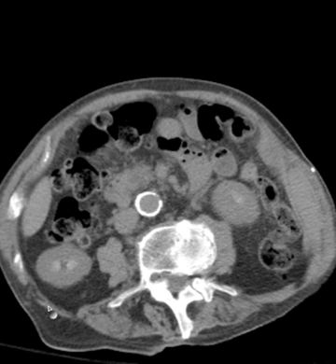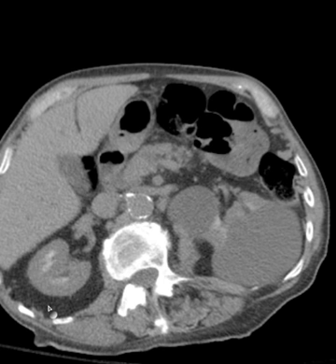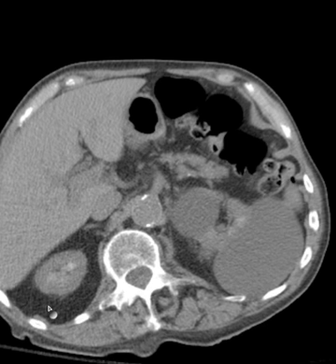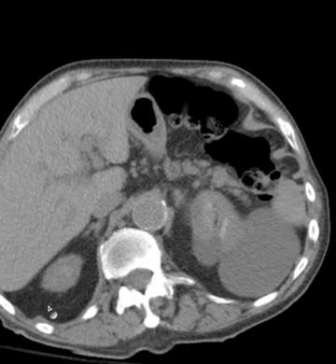Hello, Dr. Mintz here. This is a case that's very interesting because there are a few findings. I'll go through the incidental findings here first.